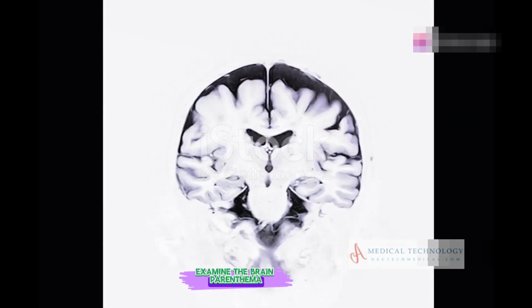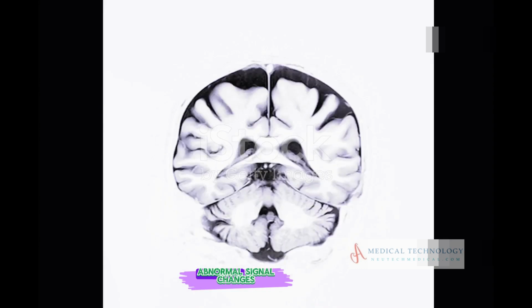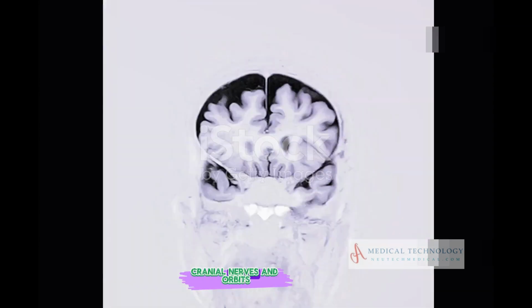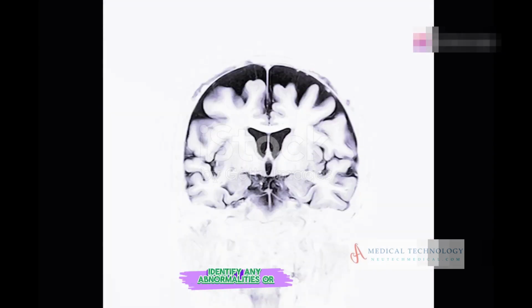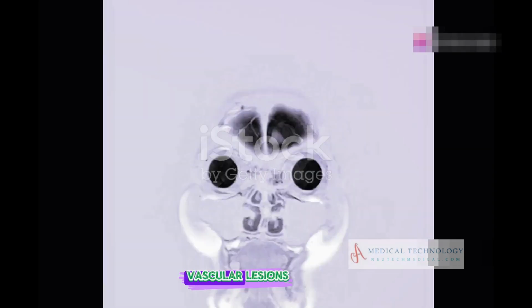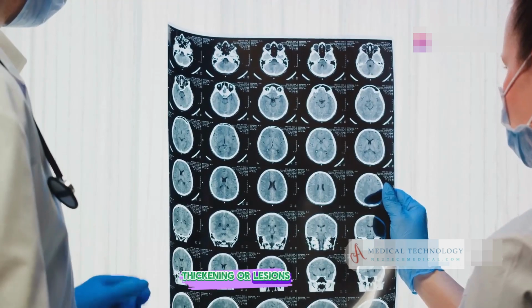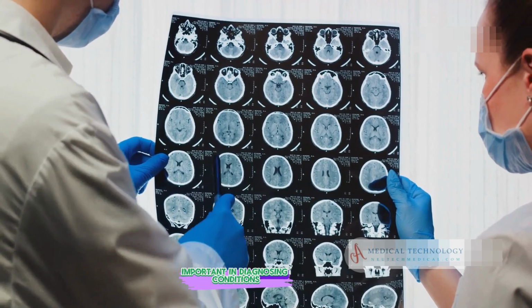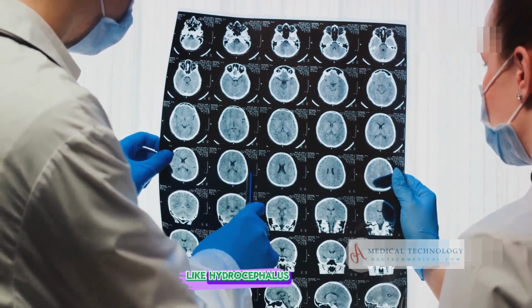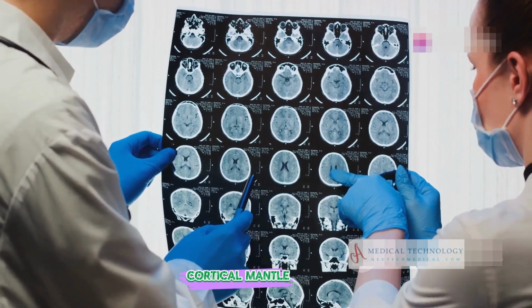Examine the brain parenchyma. Differentiate between gray and white matter and look for any abnormal signal changes. Cranial nerves and orbits, check for abnormalities. Blood vessels, identify any abnormalities or vascular lesions. Assess the cortex for signs of atrophy, thickening, or lesions. The ventricles should be checked for size and symmetry, important in diagnosing conditions like hydrocephalus. Hydrocephalus: enlarged ventricles with thinning of the cortical mantle.